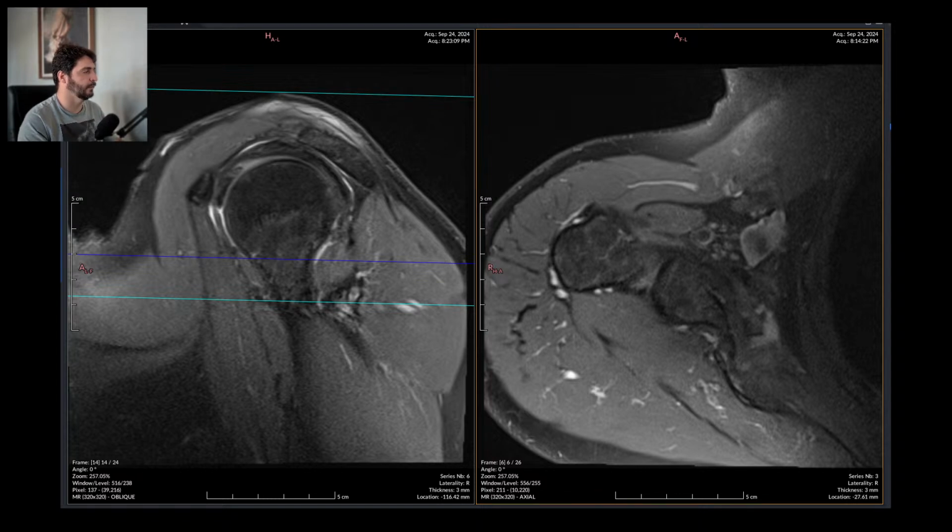This is one of the possible worst case scenarios for a shoulder MRI. So let's send this in and let's go to the emergency. There are 58 emergency CT scans on the queue for report.